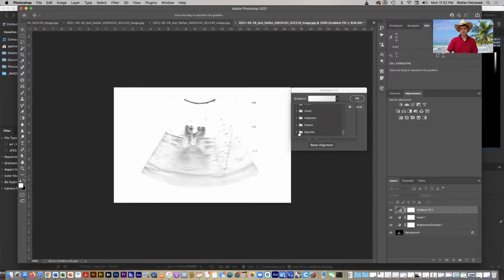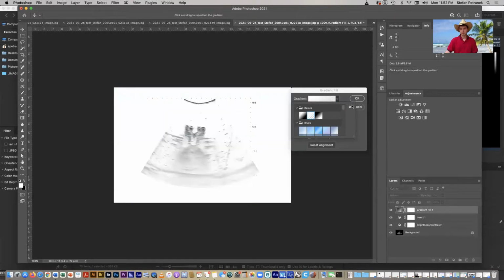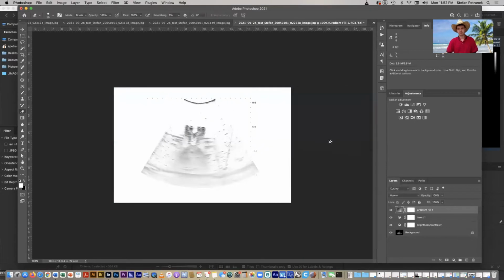But there are many possibilities with this. Although not quite as many as I wish, it's a more complex tool, but we don't have time to get into it. So, a couple other additional ways that you can edit your images.